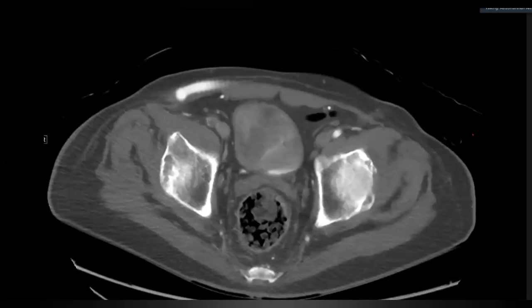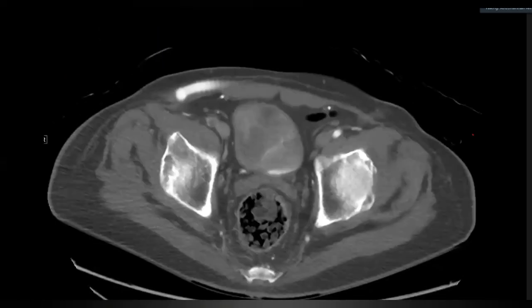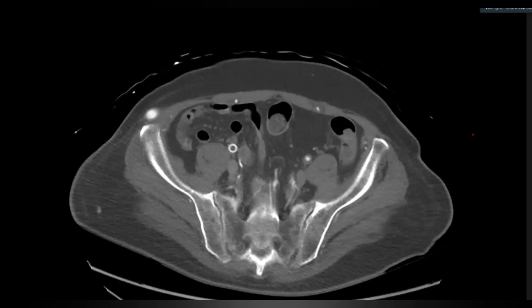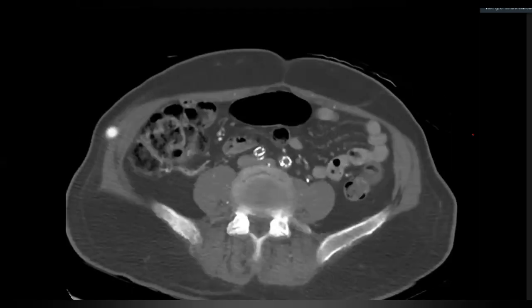Okay, I'm going to go down one more slice. So this tube ended up joining something like this and something like this. So do you know what this is? What have I shown you? No, sir, I haven't seen it before. I think this is also opacified with the contrast, and it has some intravascular connection, but I'm not sure what that stent is.